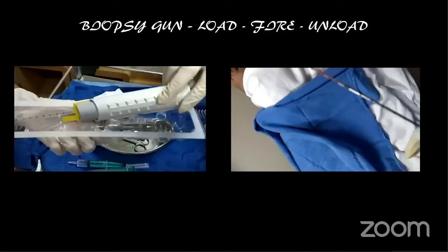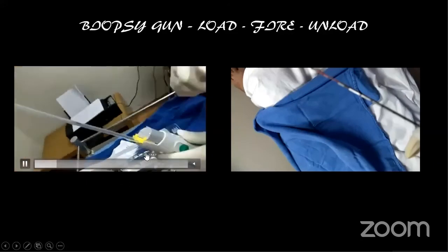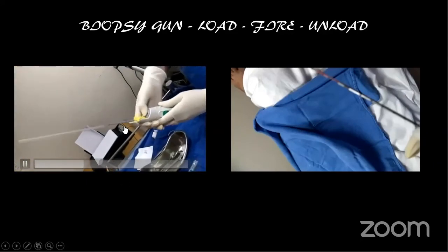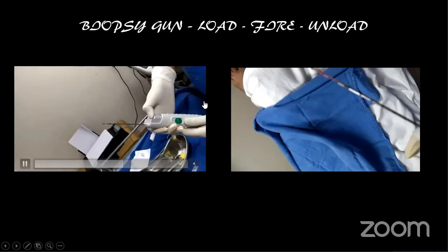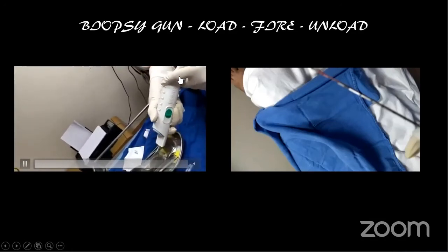Now, I will be demonstrating short videos of the use of the hardware also, for the beginners. Now, this is the biopsy gun. It comes like this in a packet. We load it by pressing these 2 buttons, which are here. Push out the lock. It has a lock here. And then fire it with this front button, or we have a back button also. So loading with 2 buttons, firing with front or back button.